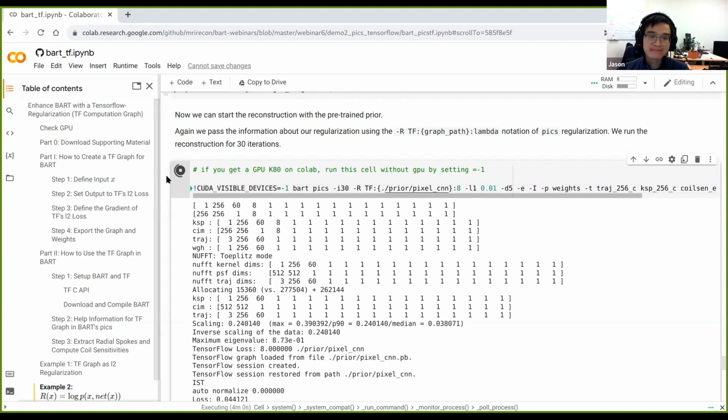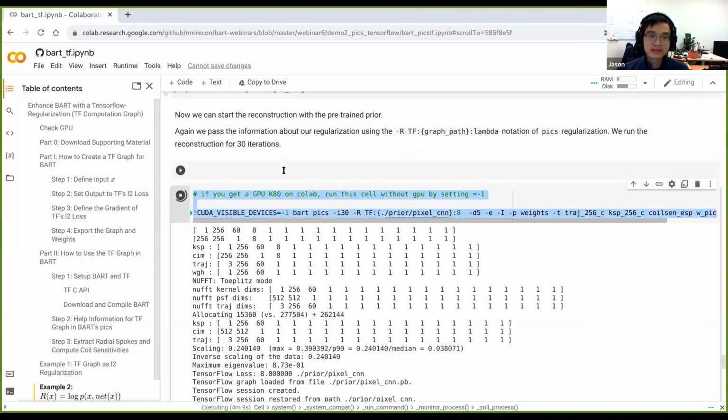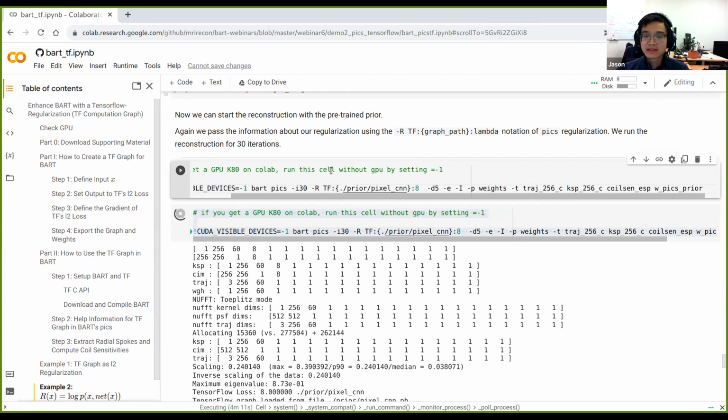Yeah, I mean, now it's still running, right? You can test it later. It should work. You need an -R after the -L1. Yeah, I think you need an R option, but you should be able to combine several R options, also with the TensorFlow.